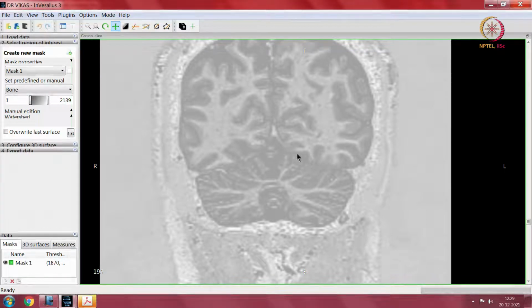The boundary is obvious, but it is not obvious on imaging. This is one of the fallacies with current imaging: though there is good resolution, it is nowhere near actuals, and it is with actuals that we deal when we are actually treating patients and people.